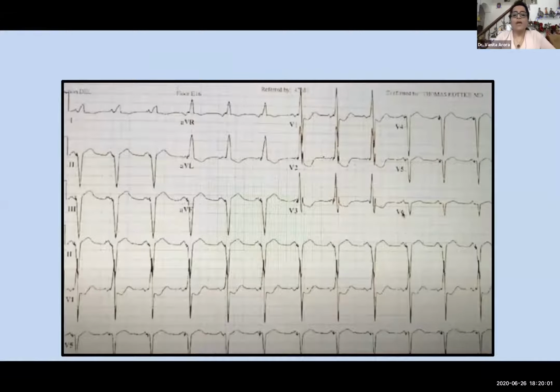If we see an ECG like this, there is another example of biventricular pacing. Look at V1. The V1 is all positive. If it is all positive, it is pacing the LV. 2, 3, AVF is negative, which is good. But look at lead 1. Lead 1 is again positive. This has to be the middle cardiac vein. And in the middle cardiac vein, until and unless it's a really lateral site where you can place it, you cannot correct this thing.